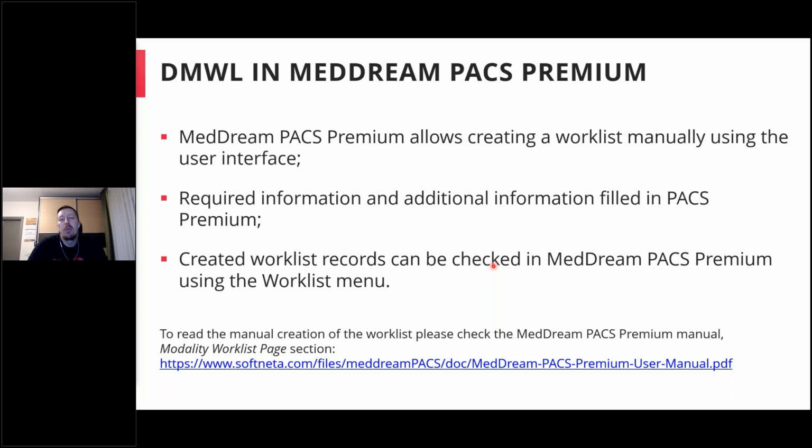Of course, the first one is the easiest one, and the most manual one. So by logging into the user interface and creating a worklist. How to do it, and more information, you can find in our PACS Premium manual on the modality worklist page. So there is this section, and you can find more information here.